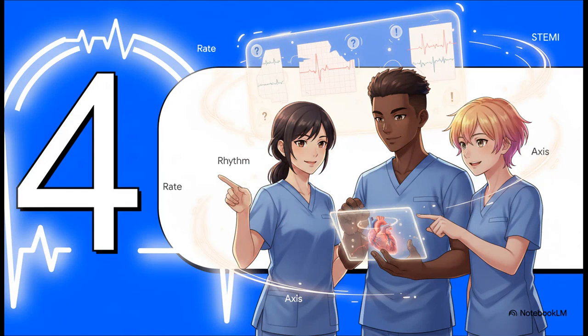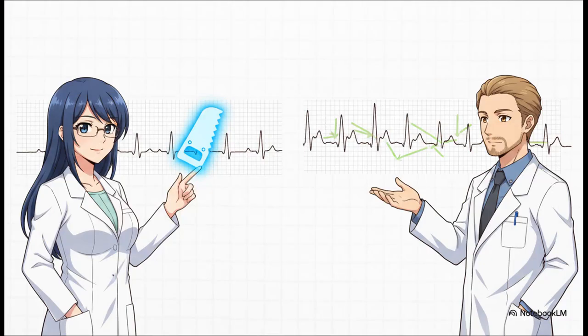Okay, awesome. We've got our system down: rate, rhythm, axis. Now we get to the really good stuff. Section 4 is all about using that foundation to start spotting the classic high-yield abnormalities. These are the ones you are absolutely 100% going to see on your exams and on the wards. Let's start with two of the big ones, a flutter and AFib.